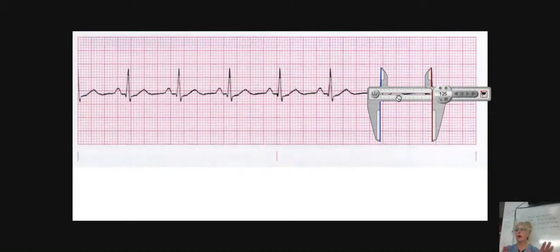So don't worry about whether or not you've pulled a 6-second strip. The machines automatically, when you push the button, will spit out a 6-second strip. That's what the machines are programmed to do. And then in about half an hour, 40 minutes, I'm going to bring out an ACLS AED monitor that shocks people, and it's got a monitor, and we can make different rhythms and things like that, so I can show you real time what it looks like.